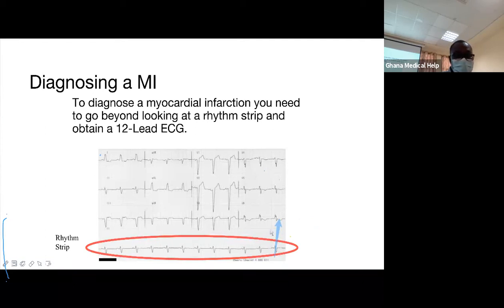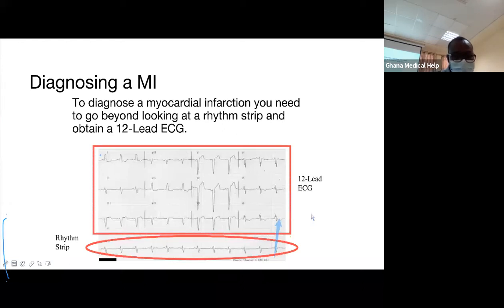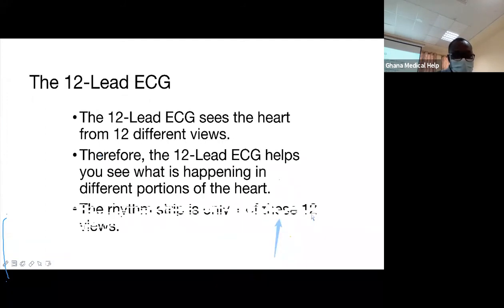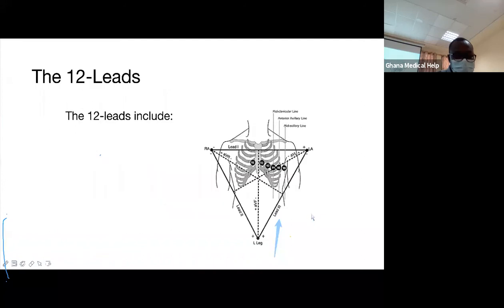Usually for the 12 lead ECG, the one down there, typically we select lead 2 to be the rhythm strip. Sometimes some people do select other rhythm strips. You can always select that on the ECG machine. We have one here that we'll be looking at practically. So that's the 12 lead ECG, like I've already said. Of course, I've explained this already.